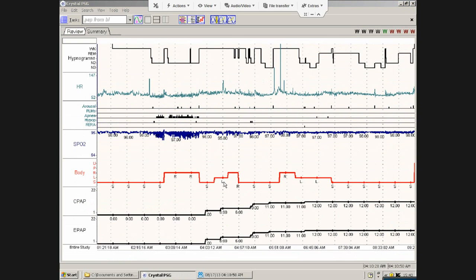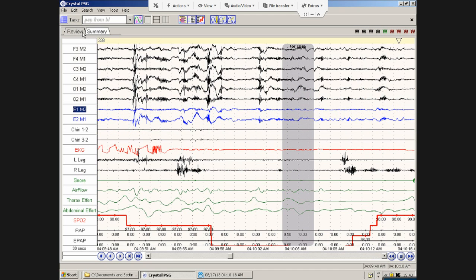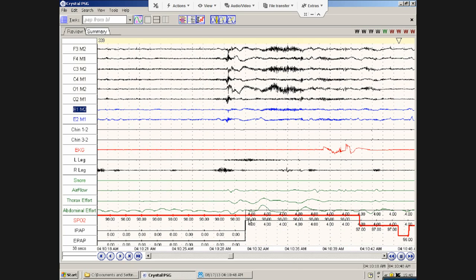If you were to go back to here and kind of guesstimate where the PAP line is, you would go there and just pick review. Where are we? 338. We're pretty close. Look down here. It's zeros. Oh, there it is. 4. That is the epoch where we started PAP. So to move lights out.